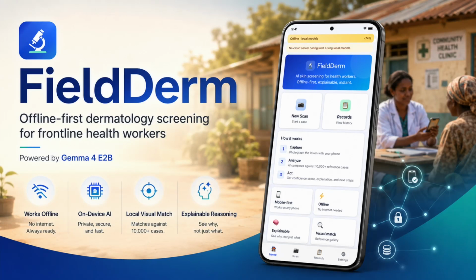FieldDerm is an application running on your phone to help health workers diagnose skin diseases. This is a completely local application running on your phone with the Gemma model, which helps you diagnose different diseases based on the images you share with the model.